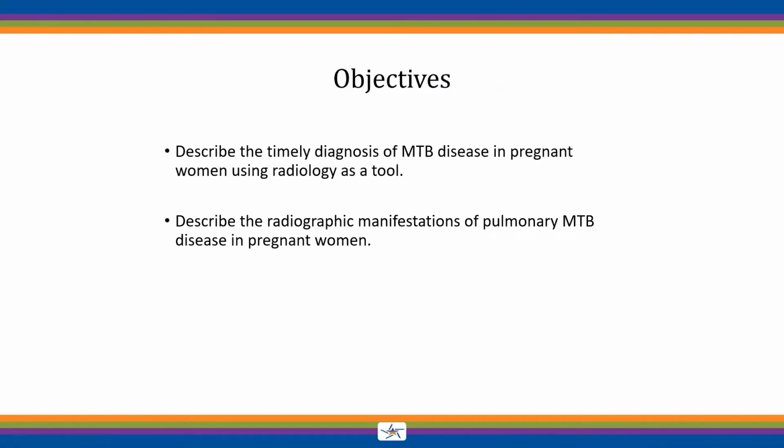So I'm talking to you about using radiology as a tool to more timely diagnose pregnant women with MTB lung disease, and then also to show you some radiographic manifestations of pulmonary TB disease in women.